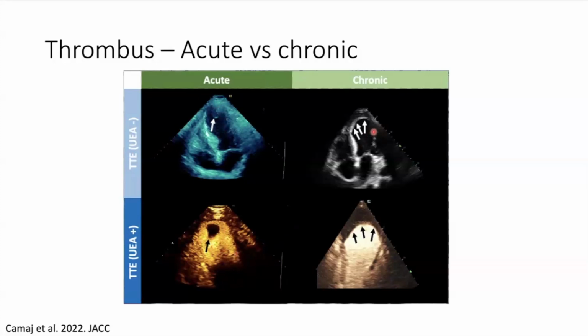When we look for chronic thrombi, it becomes a lot more calcified and layered, following the contours of the left ventricle. And the key features are that there's a bit of a sharp demarcation from the normal myocardium to the thrombus. When you add contrast, you can see that the contrast percolates into the myocardium, but doesn't do the same with the thrombosed areas. So that's also a clue. So the main things are a sharp change in angle or flattening, and percolation of the contrast into the myocardium.